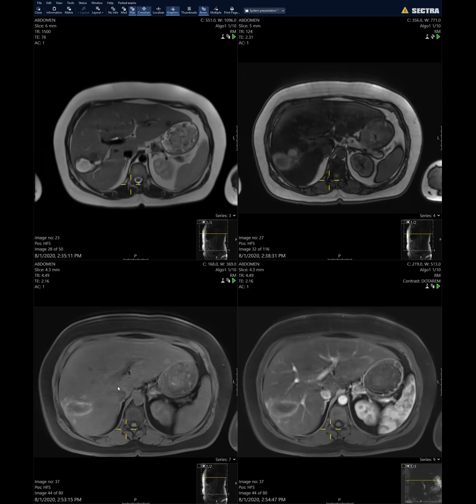I don't know, because unless you biopsy them, we don't even have proof that they're not just fat-poor adenomas. Exactly. In 2 cases, I was lucky to get biopsy, but in other cases, no. I think if it's a large enough lesion that they would actually do something about it, then it's worth biopsying. If they're small, I have now 7-8 cases, and they all look similar. Some we are just following up, and some have EOVist, so we know what they are, or maybe we can hypothesize what they are. And 2 of the cases are biopsy proven.